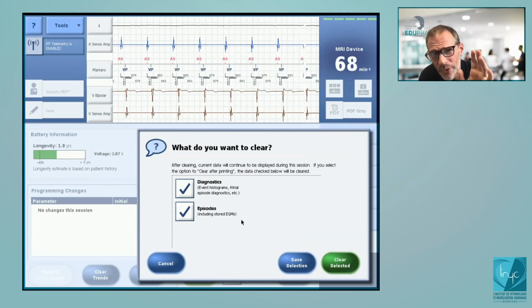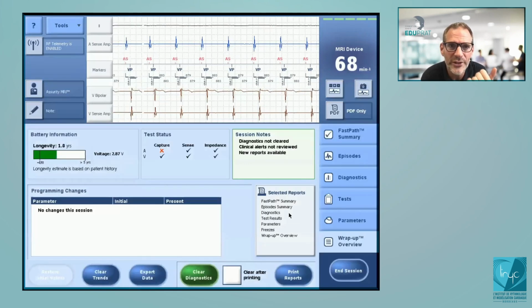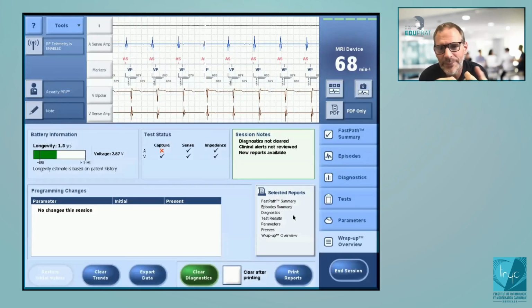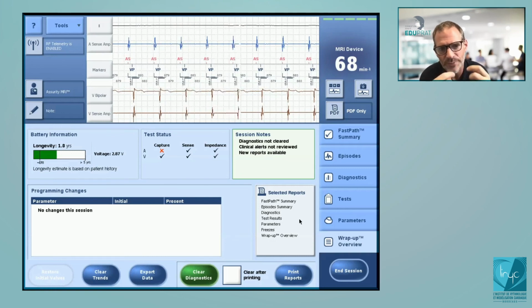You know, the programmer has been changed in Abbott devices. It is called Merlin. With the Merlin 1, it was very easy, if you have recorded a session, to re-see the episode. In Merlin 2, you will have to ask the rep of Abbott how to see the tracing. It's not as easy as it was before.